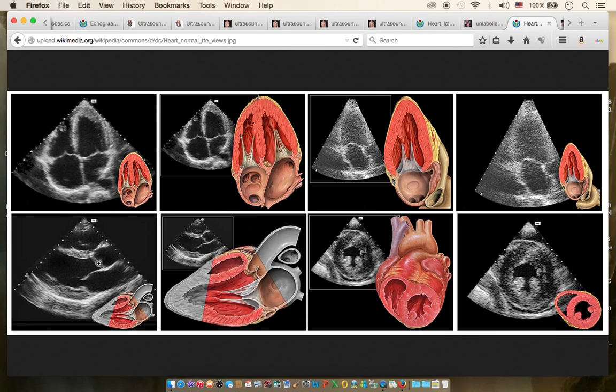Now you see the right coronary cusp. Why is it called the right coronary cusp? Because the right coronary artery arises from here, but from the non-coronary cusp no coronary artery arises. The other cusp is the left, from which the left coronary artery arises. You see this cusp is continuous with the interventricular septum. If you lose this continuation, for example if there is a gap between them, the patient may have VSD, truncus arteriosus, or overriding of the aorta.